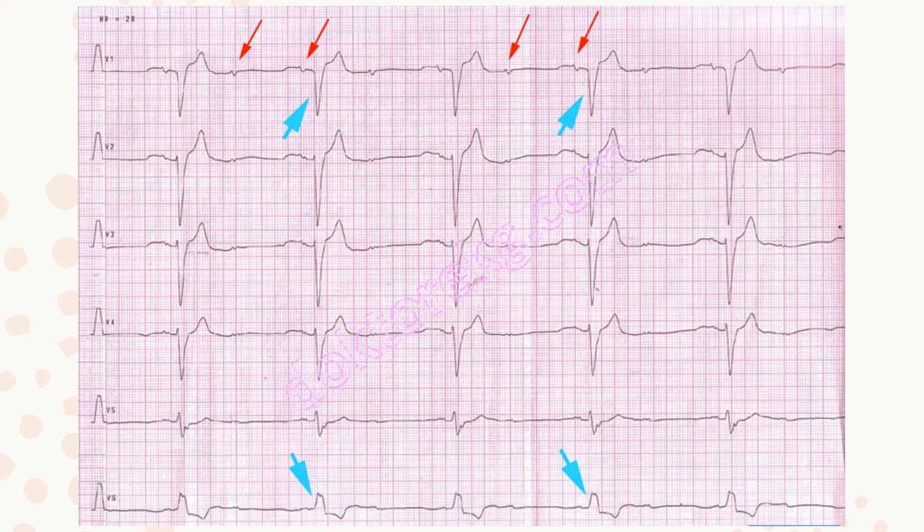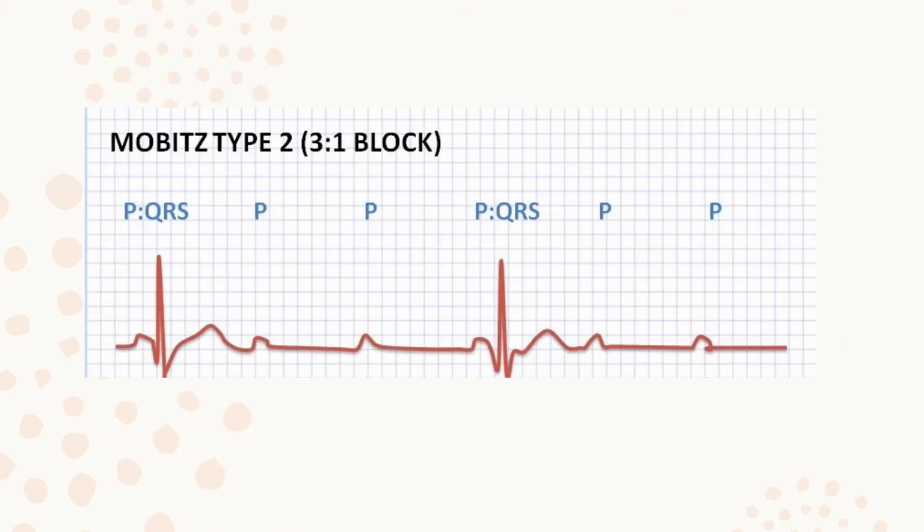And if you notice in the upper left-hand corner, the heart rate is in the 20s. So this is not typically compatible with very good perfusion. This patient, if they're awake, is very syncopal, complaining of dizziness, they don't feel well. And this is someone that's at very, very high risk for sudden cardiac death.